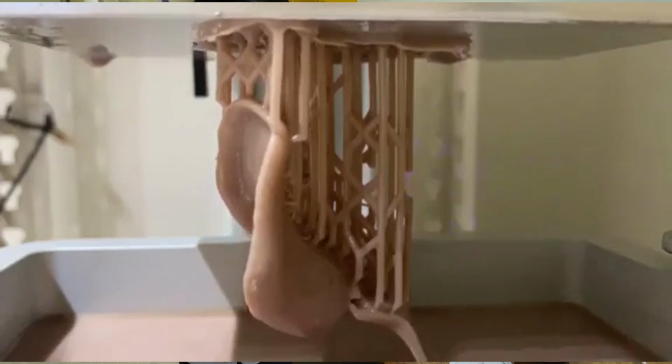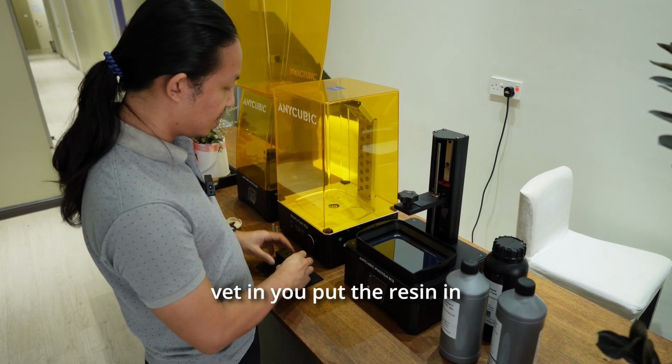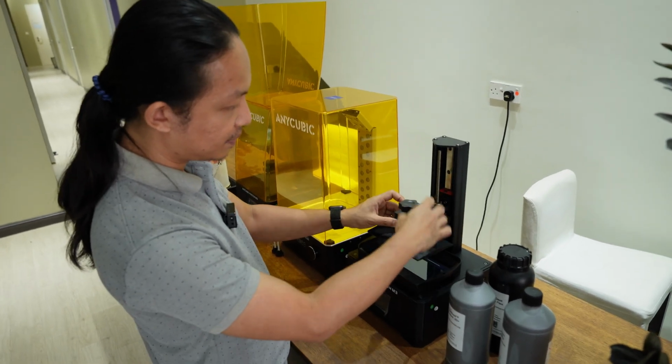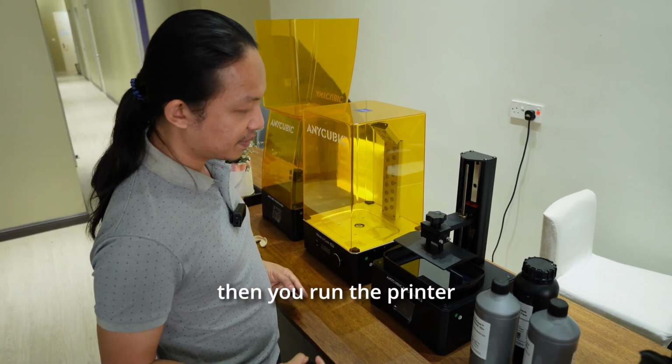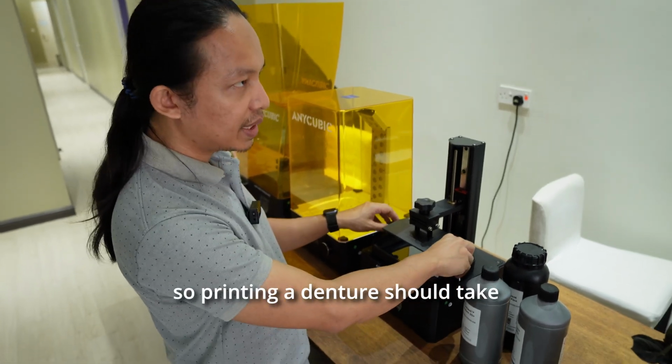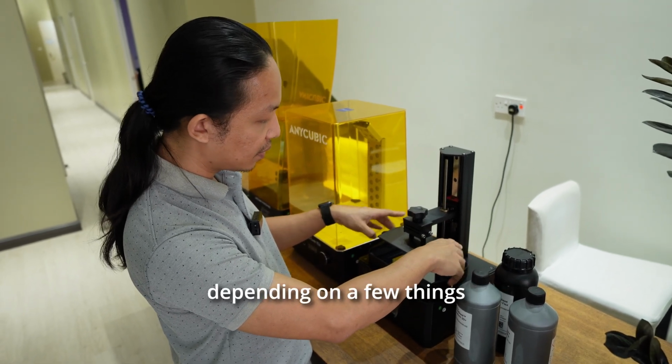All right. So you put the vat in, you put the resin in, then you put the build plate. Then you run the printer. Printing a denture should take roughly an hour plus to 3 hours, depending on a few things.